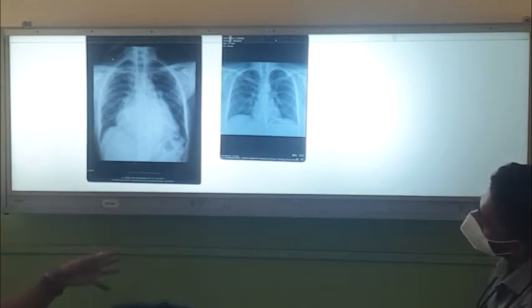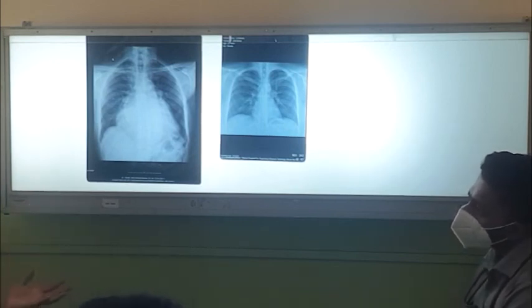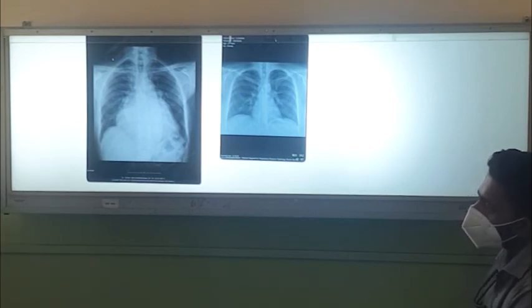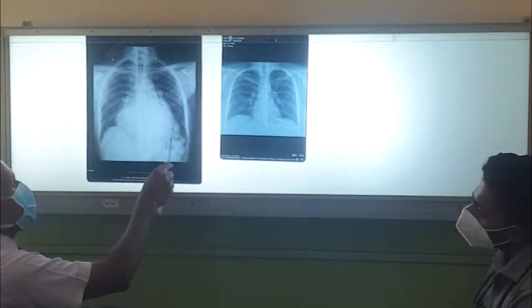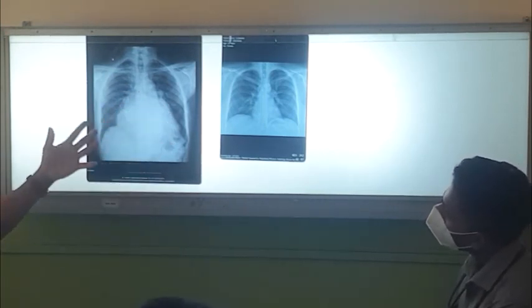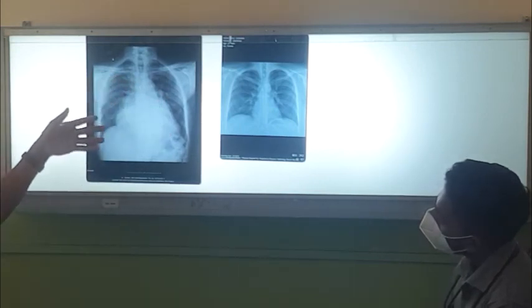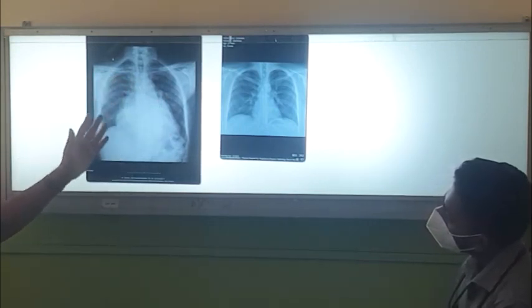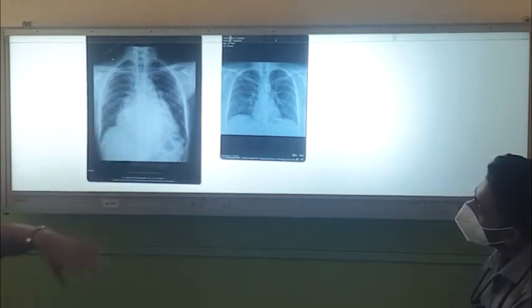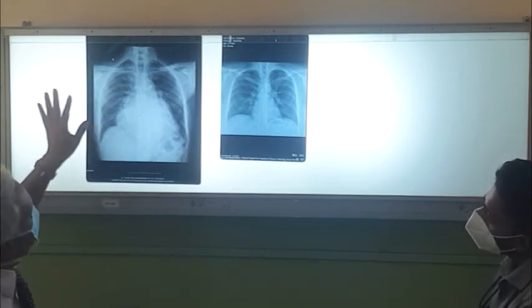When there is severe mitral stenosis, the left atrium gets hypertrophied and dilated, trying to push blood into the left ventricle, and the left ventricle is all right actually here. So this is a dilated left atrium, and then you get congestive cardiac failure, pulmonary hypertension, upper lobe diversion, pulmonary edema, and right-sided failure also, right ventricular enlargement and right atrial enlargement later on. So he has everything.